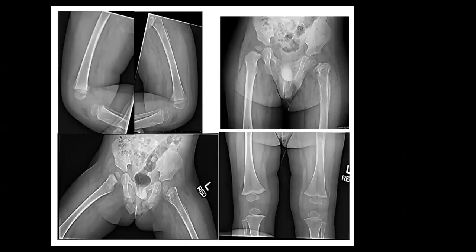Okay, so let's go over this. Unfortunately, I disagree with you. The radiographs showed very clear periosteal reaction, and you could also see maybe something like Codman's triangle here. Here, you may actually describe it as onion peel periosteal reaction, and it's a diaphyseal lesion. So do you know what onion peel periosteal reaction in pediatric population means?